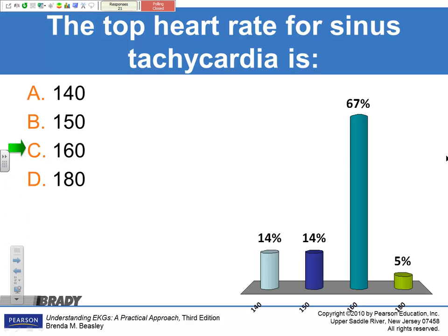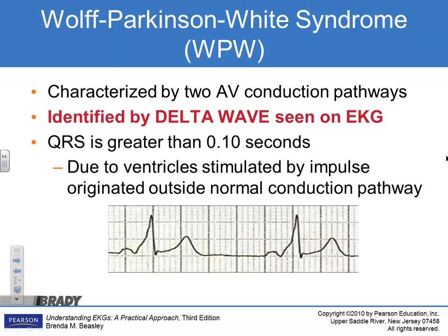About 160. At 160, you're right on the cusp of losing the view of the P wave. So there you go. All right.